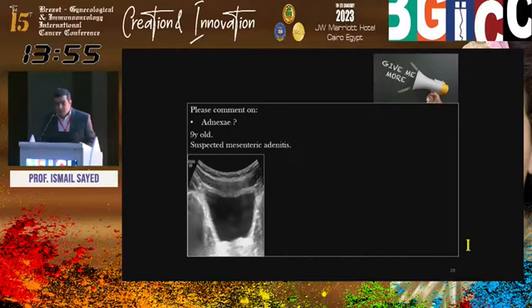Like the next case. Next case, 9 years old, presented with acute pelvic pain, sent from a pediatric clinic suspecting mesenteric adenitis or a mild form of appendicitis, but she is a female. Remember, when presented to the ultrasound unit, the pain has faded away. No pain. Pain on and off. Think of intermittent, yes, but unfortunately I couldn't see both ovaries by abdominal approach.